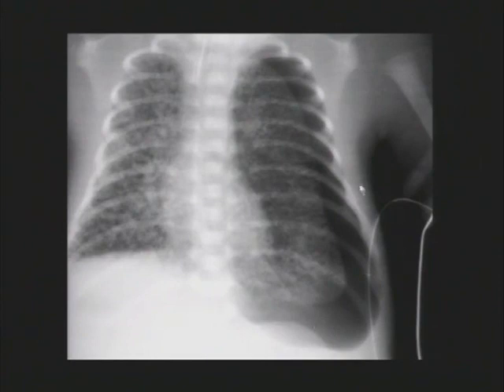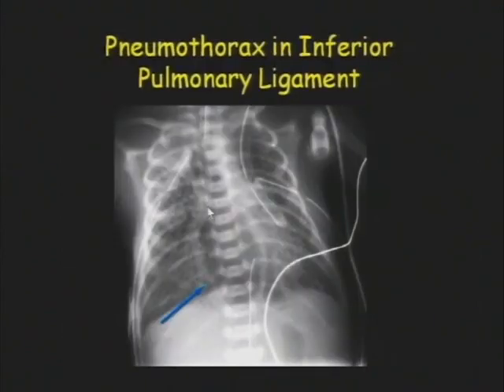And here you can see how stiff this lung is, because this is a huge pneumothorax, anterior, lateral, and inferior components, but the air that's in the interstitium prevents that lung from collapsing, so you can imagine how it's preventing air exchange as well. And in fact, the extreme pulmonary interstitial emphysema on both sides causes microcardia in this patient. They are limited in their venous return because of the large volume of the lungs in the chest, and these patients can be hypotensive as a result.